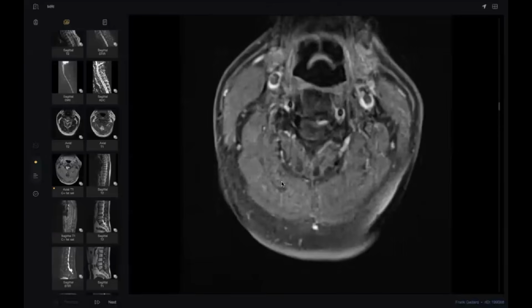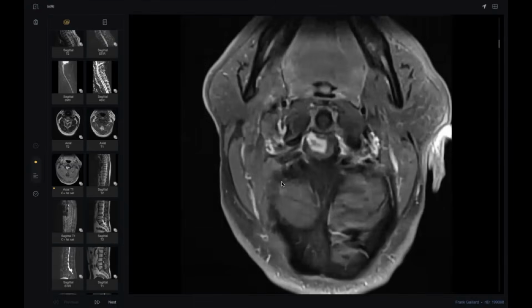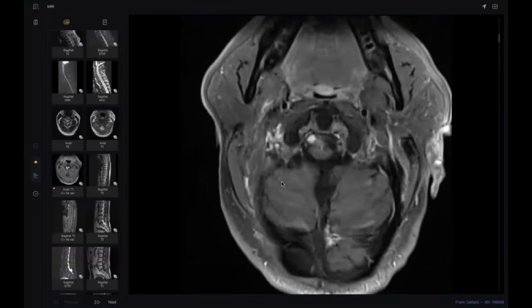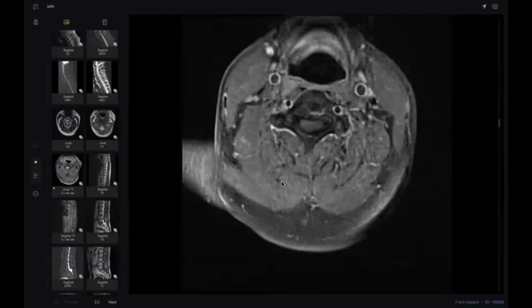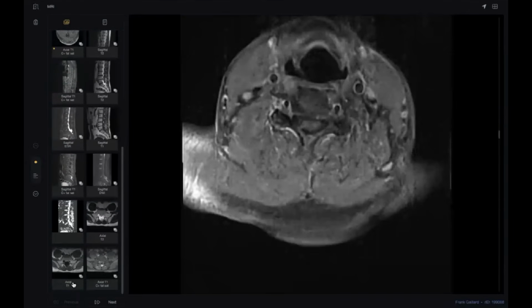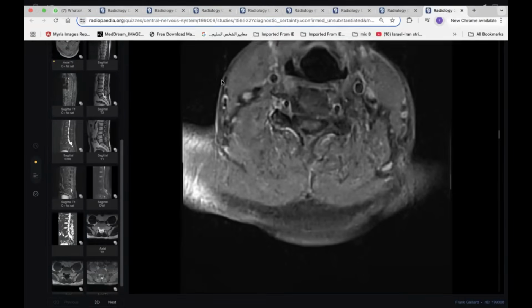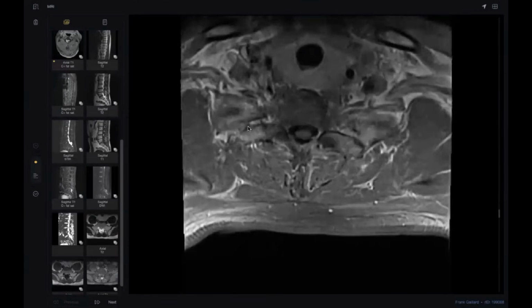So the lesion is intradural, intramedullary, heterogeneous, with peripheral enhancement. I would like to check the ADC and the diffusion. Not available. What's your diagnosis? Okay, so intramedullary lesions in the upper cord with these appearances are either ependymoma or astrocytoma. Other possibilities could be metastasis from brain lesions. So I would like to correlate with the patient's history.